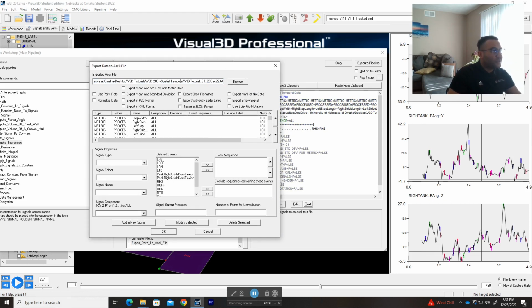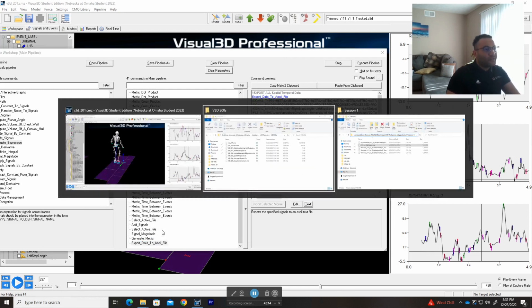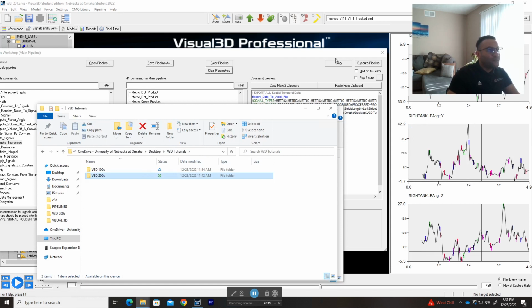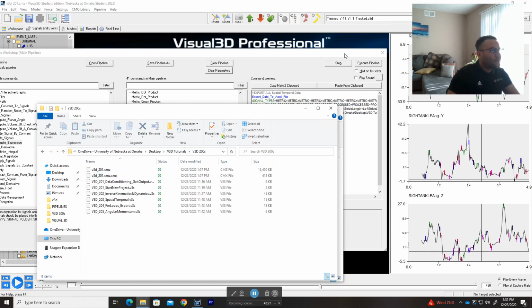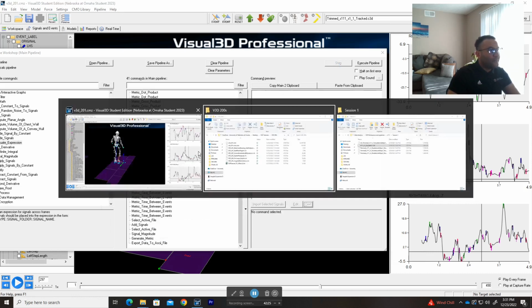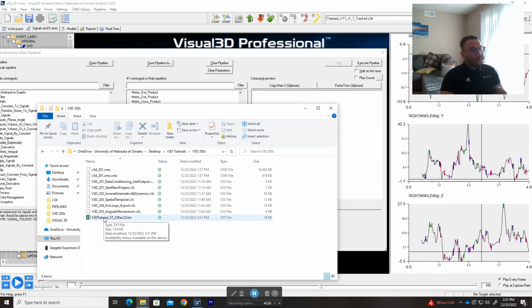See, it's always good to double check. I'm just saving it here, actually inside of here. So, alright, let's step it. It should work fine. And then you see it here.